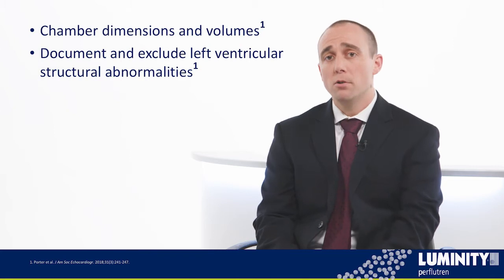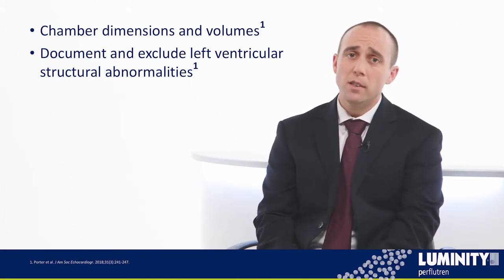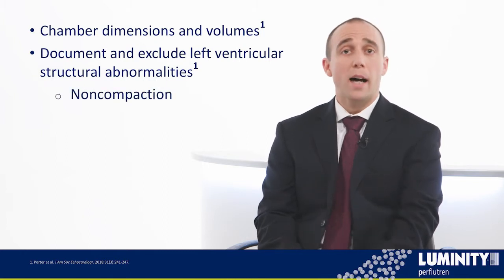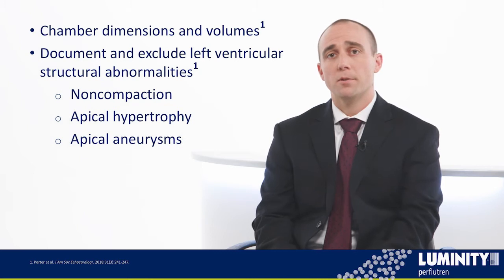As we know, our volumes are much closer to those of MRI, which is the gold standard, with using an image-enhancing agent. Also to document and exclude certain LV structural abnormalities, especially in the apex. For example, non-compaction, apical hypertrophy, and apical aneurysms.